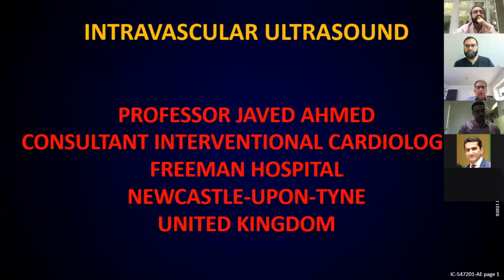Intravascular ultrasound is a catheter-based invasive imaging modality that has become an essential adjunctive tool to PCI over the last 20 years. Even though there are many uses of intravascular ultrasound in the catheterization laboratory, I feel the interventional cardiologist has two fundamental questions to make a proper decision when performing PCI.